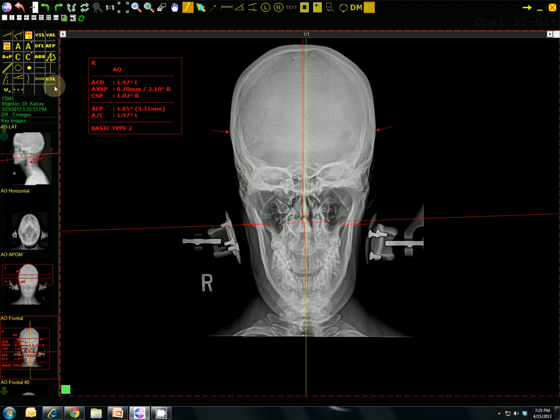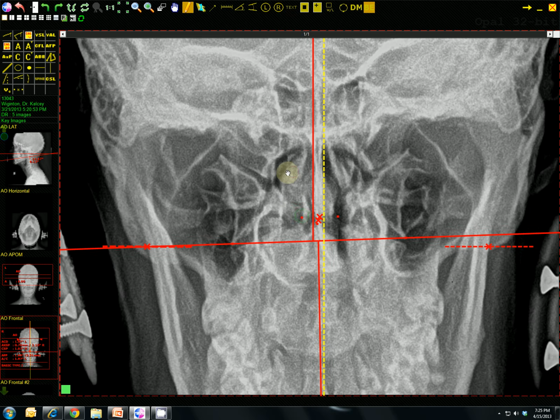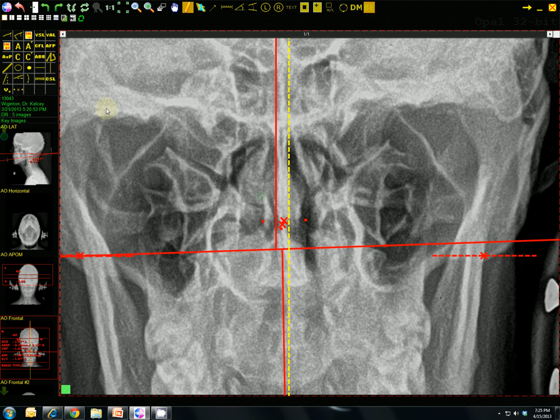At that point, we need to do the condylar circle. So zoom up again. Make sure that you put the 2 markings on the outside lateral edges. So here's the condylar circle right there and right there. So we'll place one down, place one on the other side, 1/4 inch in and 1/4 inch in. Now we need to measure to make sure that that's actually a 1/4 inch.